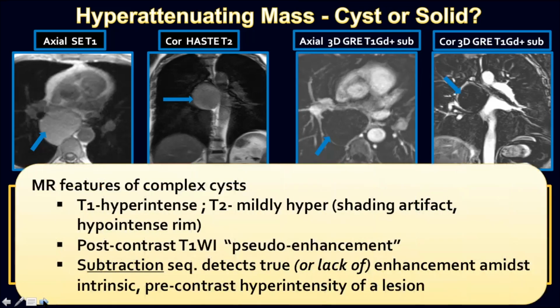And it is the subtraction images which really confirm the absence of any true enhancing component amidst intrinsic pre-contrast hyperintensity of this lesion. And so you're quite confident about your diagnosis here.